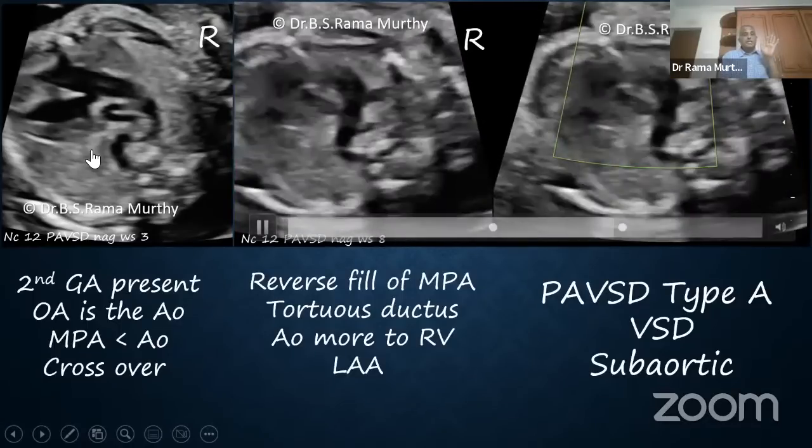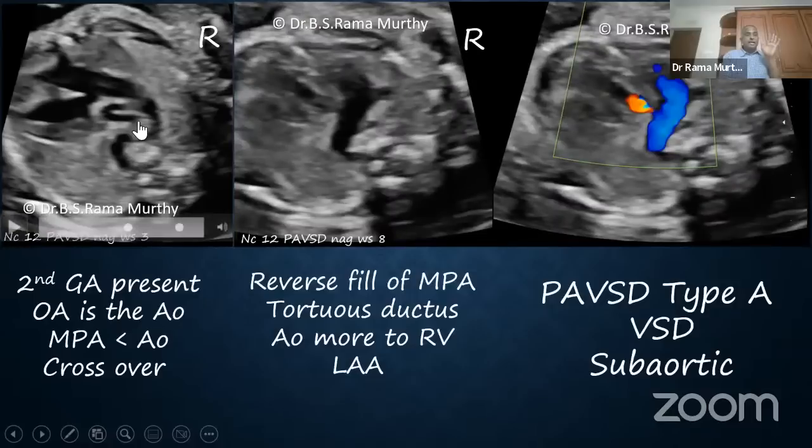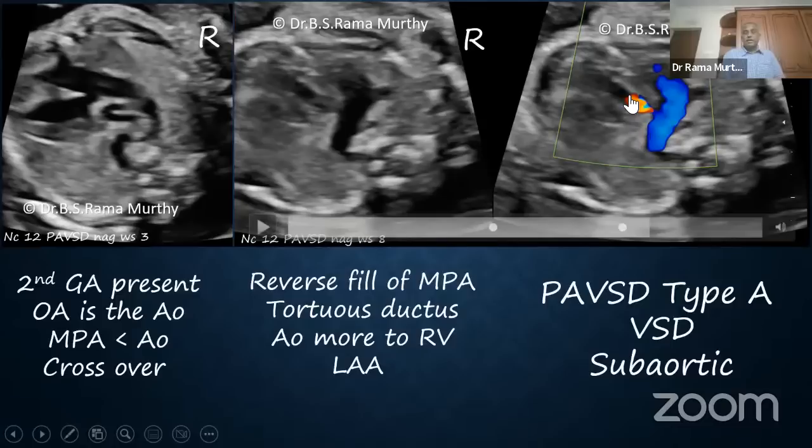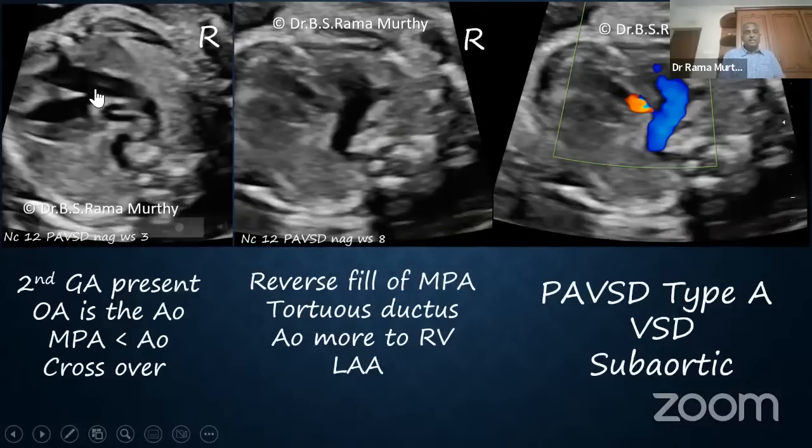And in PAVSD, again, a classical finding is a ductus which is tortuous, and that is a tortuous vessel that you see here. Ductus arteriosus is tortuous in cases of PAVSD. So that's PAVSD type A. Why type A? Because it's a reversed ductal filling, ductus dependent filling of the pulmonary artery, and the VSD is subaortic.